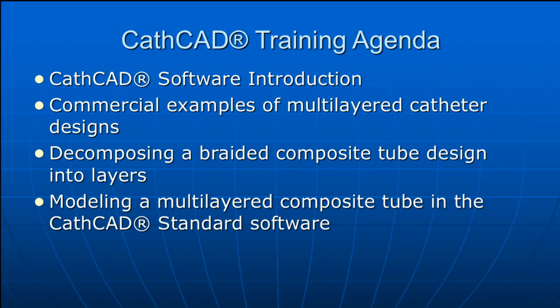The agenda for today's training video consists of the following 4 items. First, we will provide a brief introduction to the CathCAD software. Second, we will provide some simple published multi-layered composite catheter designs. Third, we will provide an example of decomposing a braided composite tubing into layers. And finally, we will model a multi-layer design in the CathCAD software.